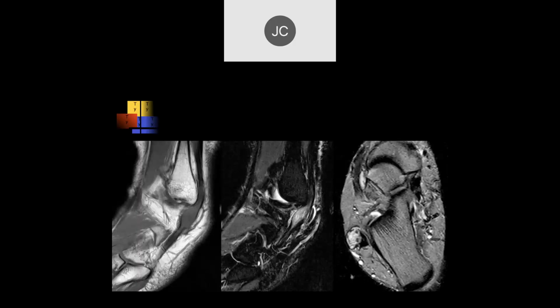Okay. It's like a thickening of the sheath, like of the peroneus brevis. Well, let's see. So you're looking at this, yeah, right? I'm looking at this.